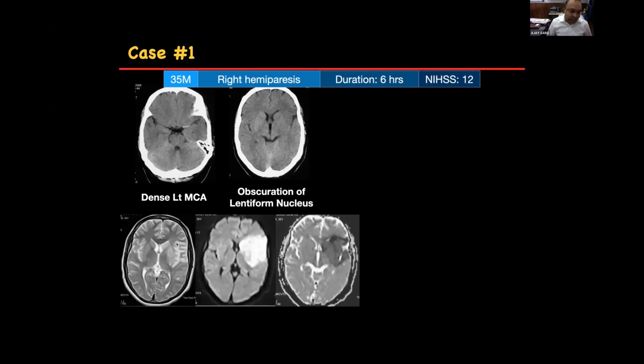In MR, I just want to describe the MR findings in acute ischemic stroke. In MR, we'll see changes involving both gray and white matter. Like in this case, we see involvement of both the cortical structures plus the deep gray matter. And these areas are bright on diffusion weighted images and dark on the ADC map. So that suggests there is restricted diffusion.